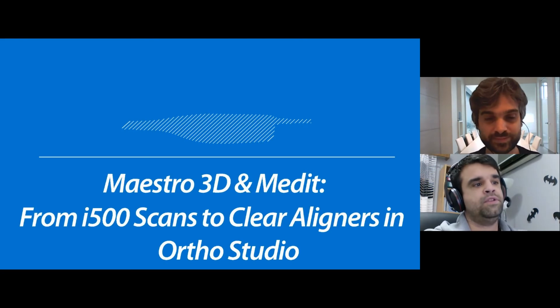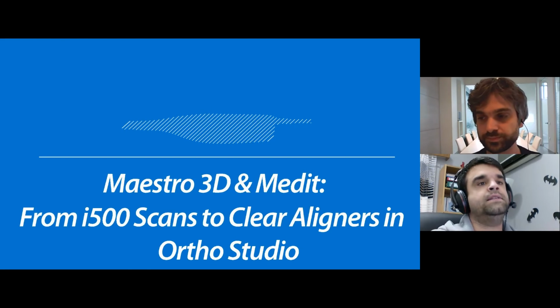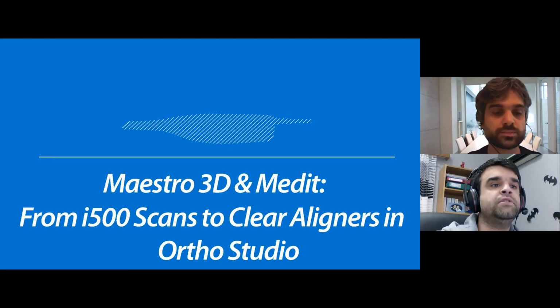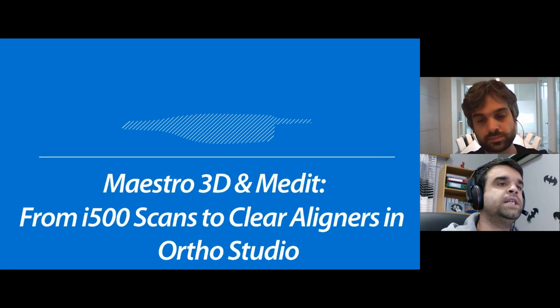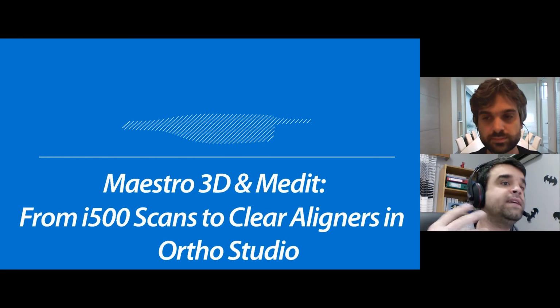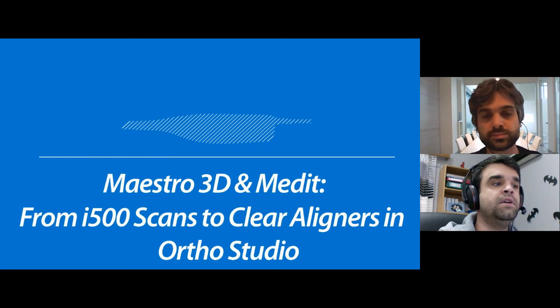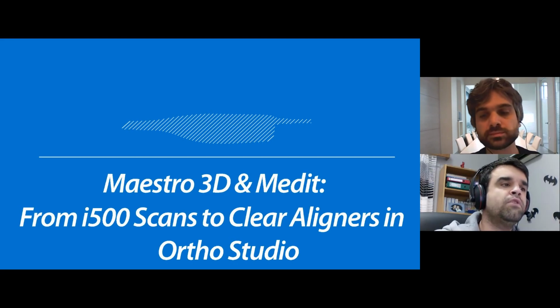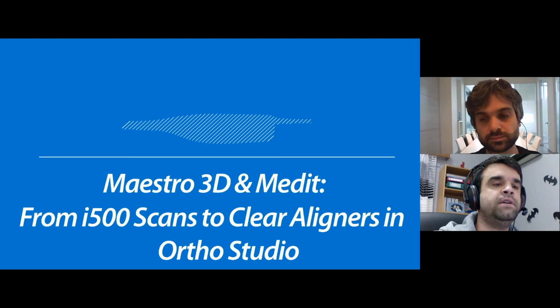So, thank you very much, Giuseppe. Now let's see what we will talk about today and what we will show you. First, I will start with my presentation, and I will show you the whole workflow that the orthodontist will have to perform through our platform by using our scanner, and what kind of functions they have available, so it will be possible for them to take the most of it. And of course, after that, we will show the workflow that you need to proceed in order to make sure that you have a very smooth passage to Maestro Ortho Studio, which is the software that we will talk about today.